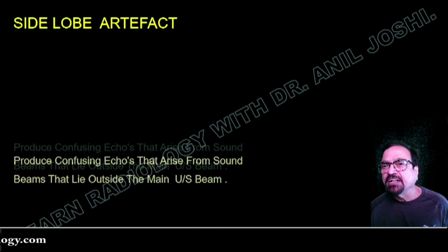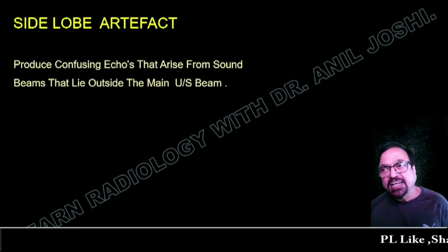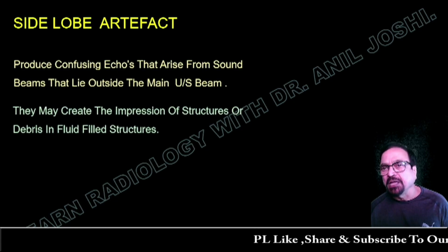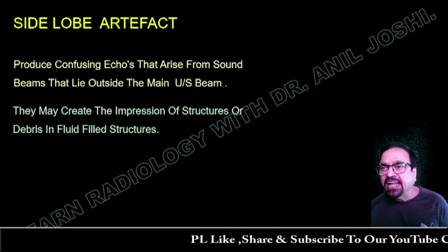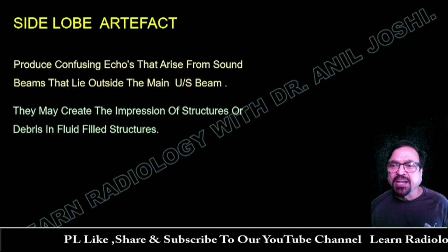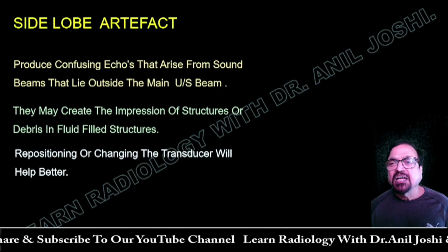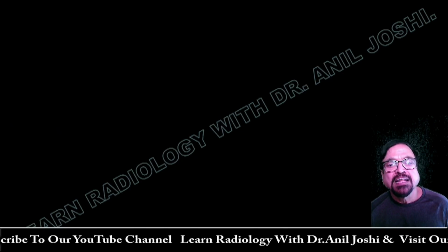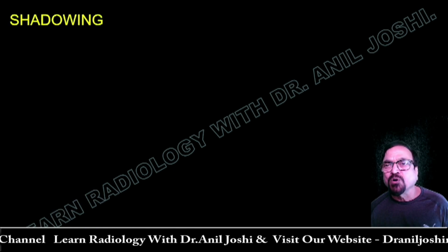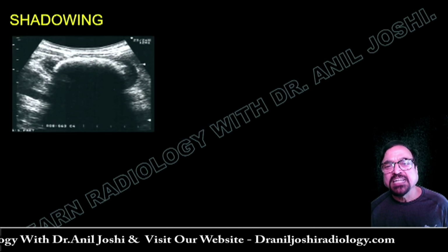Now, what are side lobe artifacts? These produce confusing echoes that arise from sound beams that lie outside the main ultrasound beam. They may create an impression of structure or debris in fluid filled structures. Now, repositioning or changing the transducer will help. As I told you, ultrasound is a change. Change the patient, change the probe, change the angle, and in spite of that, if you still see the things, then you start interpreting them.